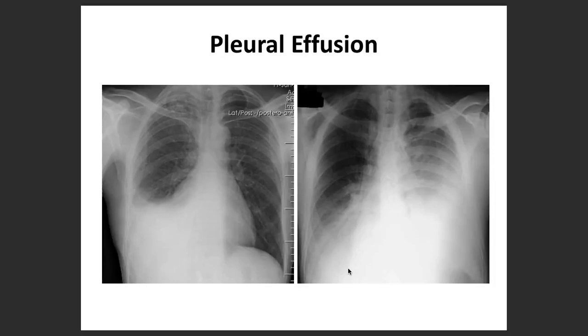I taught so many shortcuts as well. Okay, good, that's good thinking, in fact. I really appreciate it. The other thing is, can you also comment about the amount of pleural effusion? How much ml is it? Is it mild or minimal pleural effusion, moderate, or very severe?